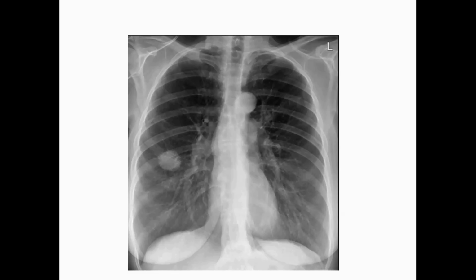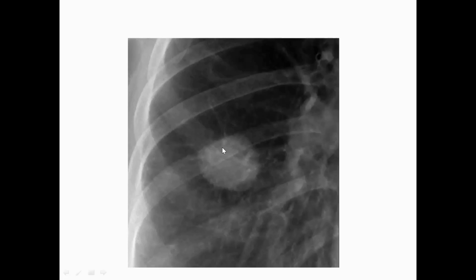This patient was a long-term smoker, presented with cough and finger clubbing. Okay? What do you see? Yeah. It is a well-defined mass of maybe 5-6 centimeters at the right middle zone at the level of the hilum, which is spiky. Can I maximize it? I think I can maximize it. Yes, I can. So look, this is the same.